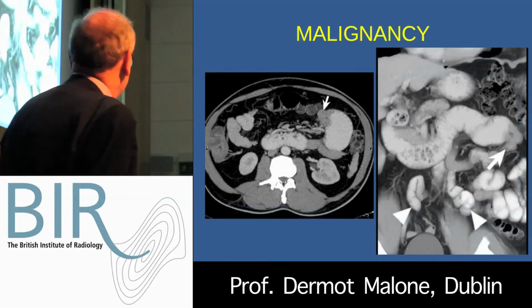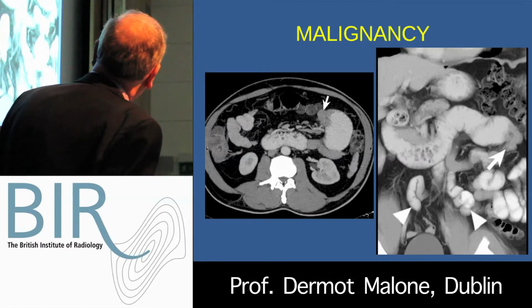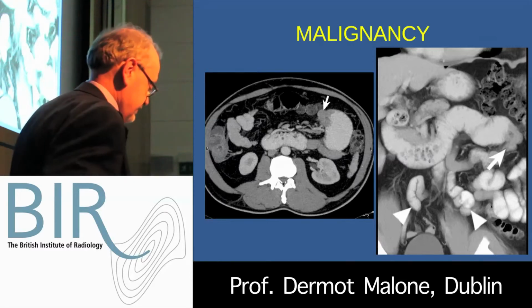And finally, we have endoluminal tumor. This is a jejunal adenocarcinoma, well seen on the axial scan, with a zone of transition and a bulky tumor mass. And here we have a curved reconstruction with small bowel feces, the sign of chronic obstruction proximal to the stenosing adenocarcinoma.